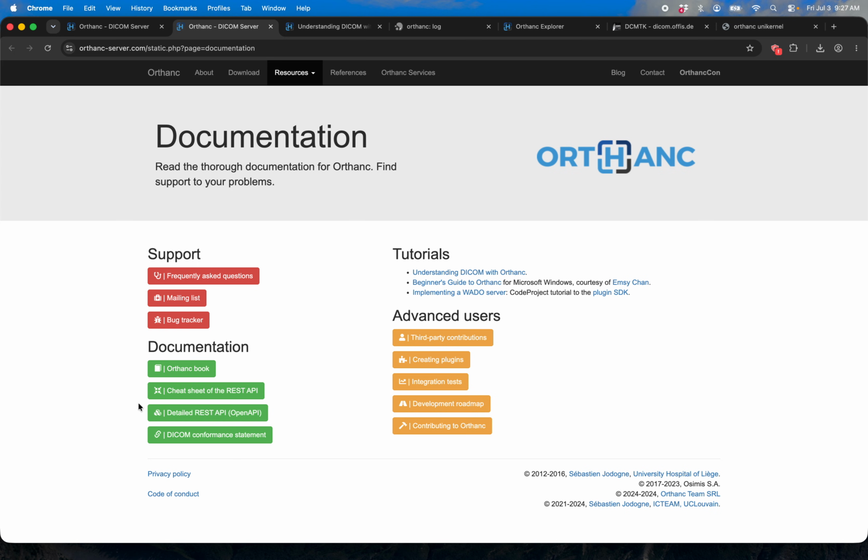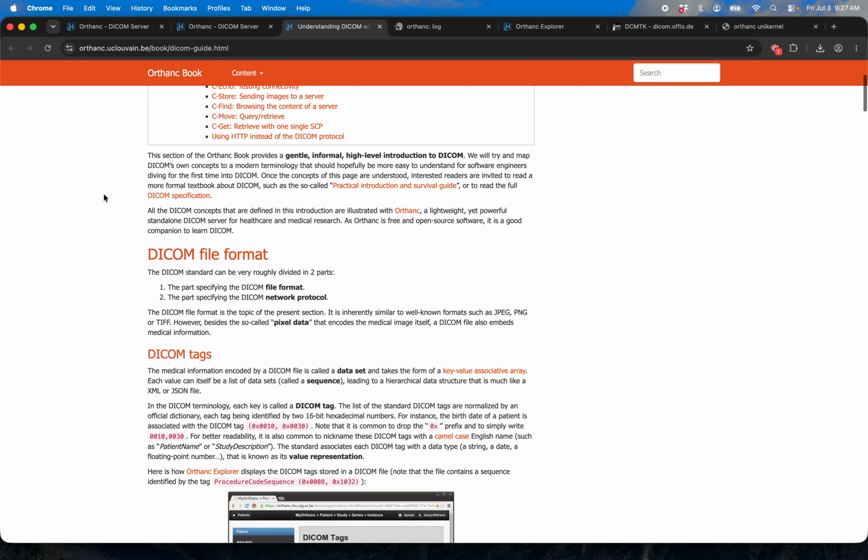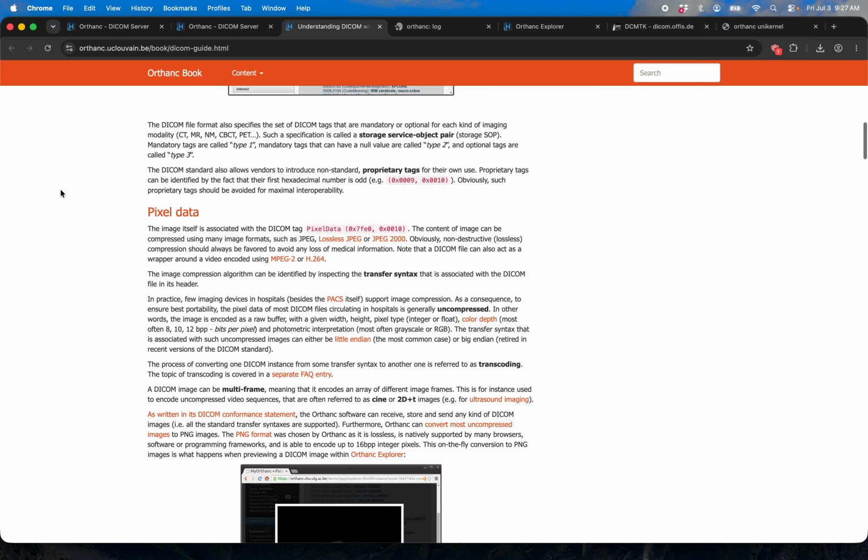And even in this software ecosystem, there's a lot of like plugins and add-ons and just all sorts of stuff. So it's very extensive in that manner. Obviously, we're not going to get to all that, but I just want to point that out. And when we're talking about DICOM, again, this is a lot more complex in terms of just like the abstractions that exist. And we're not really going to get too much into it.